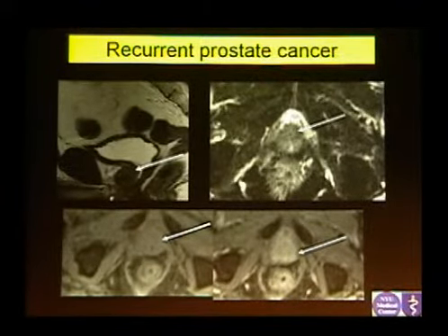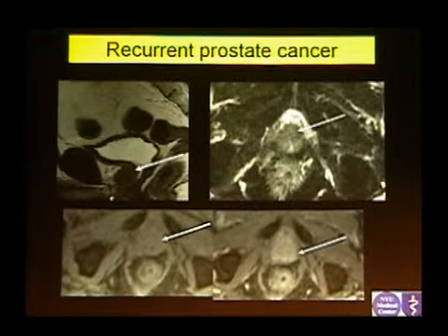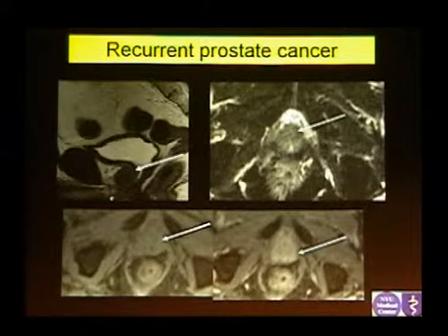Yes. The prostate is gone by definition. Usually they will remove the prostate. Some surgeons will also remove the seminal vesicles, some will not. It really depends. So if you see seminal vesicles after prostatectomy, don't be alarmed. Sometimes it's just because they left them in there, because it was a small volume tumor. It really varies from patient to patient and surgeon to surgeon.